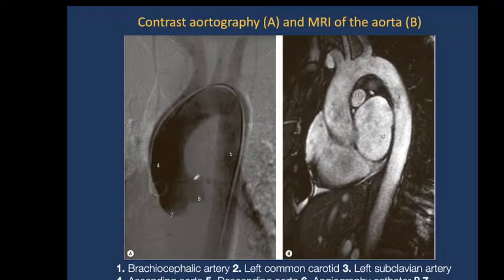And contrasted aortography. Here is a positive. This way shows us the dark contrast inside of the aorta, especially visible the first part of the aorta called bulb of aorta, and the position of the cusps of aortic valves.